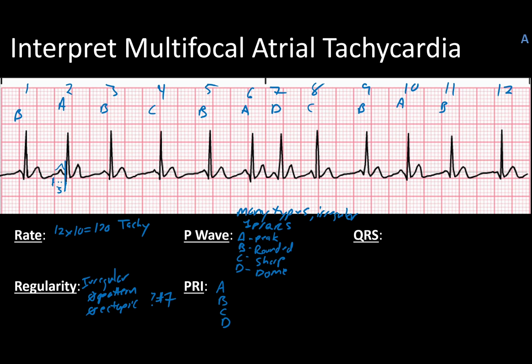Now, what do we got next? Doesn't look to be much difference: 1, 2.5 or so. We'll check another beat just to be sure. Let's say it started about there. It's 1, 2, 3-ish, so it's probably closer to 3, is what we'll call that.